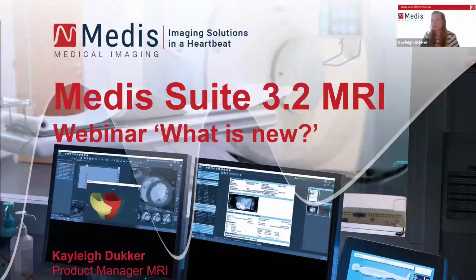We are excited to show you all the new features that we have been working on the past few months to improve our Medis Suite MR product. Today I will go over the new things that will be in the release, the major and the minor changes, and those minor changes I will show you afterwards as well in a live demonstration.